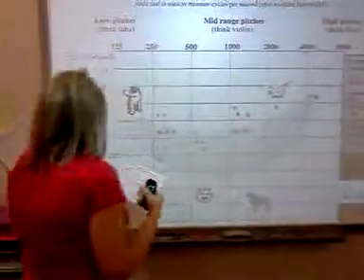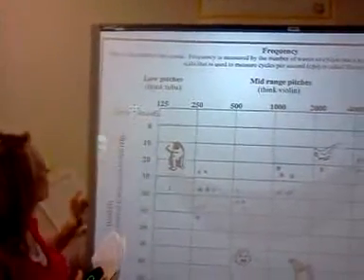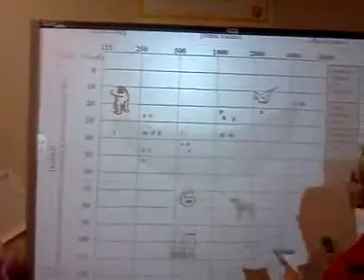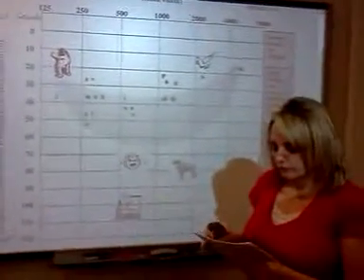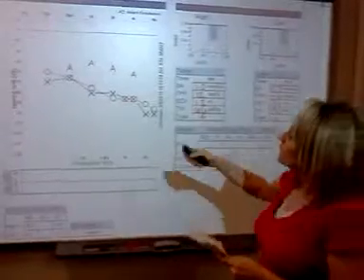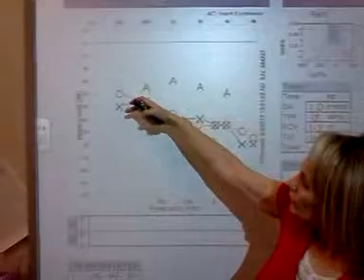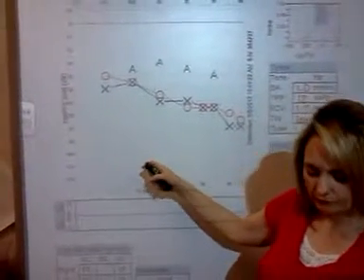Okay, so the numbers at the very top are the softest sounds that a person can hear, and the numbers at the bottom are the loudest sounds that a person can hear. So this means that the farther we move down the audiogram, the louder the sound, the bigger the decibel number, and the greater the hearing loss.